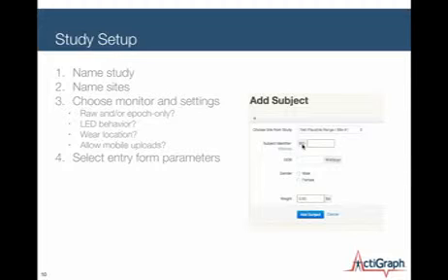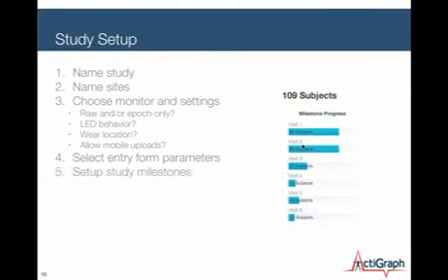Whatever units you wish to use. If you like to use kilograms instead of pounds, that is an option. Date of birth can be configured a different way. So we'd work with you on that. And then we'd set up our study milestones for you.